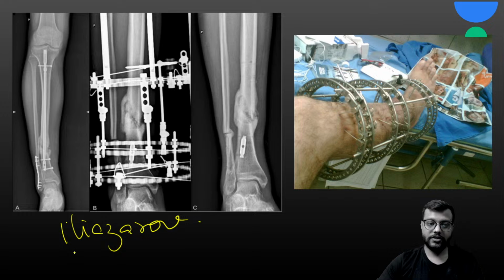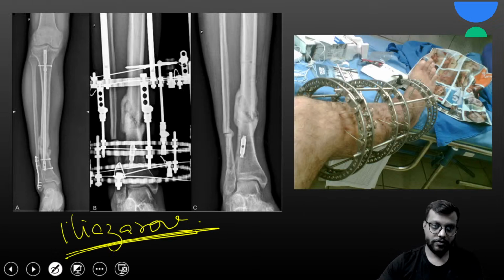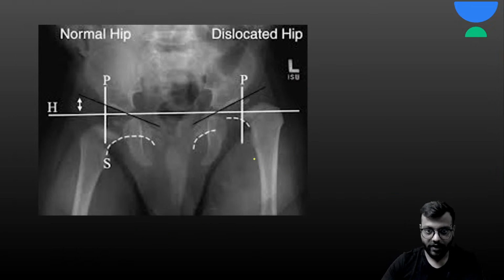which is a boon to the orthopedics, where you provide the normal biological environment, so that जो नॉन यूनियन या माल यूनियन है या फिर जो बोन लॉस है, ड्यू टू द कंप्रेसिव एंड द डिस्ट्रैक्शन फोर्सेस, यू कैन यूज दिस. ओके, हियर यू कैन सी, यहाँ पे देर इज माल यूनियन एंड देर इज लॉस ऑफ द नॉर्मल अलाइनमेंट, बट विद द इलिजारो ये नॉर्मल हो गया है. सो दिस इज योर इलिजारो, आइडेंटिफाई करना आना चाहिए.